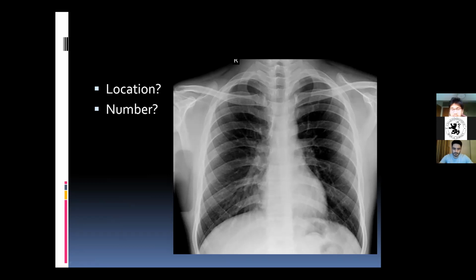on the right hand side, I want you to look at the ninth. No, there's no pneumothorax here. Look at the pleural lining. It's still all the way towards the edge. There's no pneumothorax over here. It might be a mild one actually, now that I mention it, because the lung is a little bit compressed over there, but that's not a significant aspect of this, because he's not displaying dyspnea, or we didn't really record his saturations as low or anything.